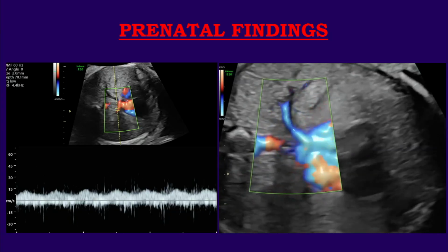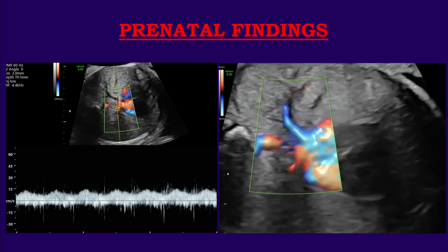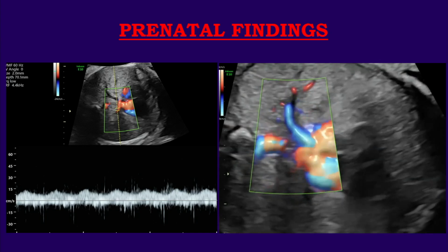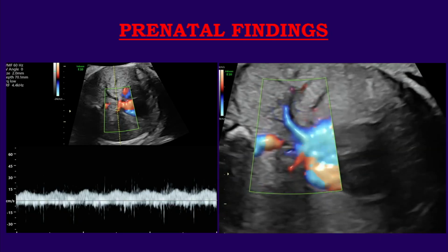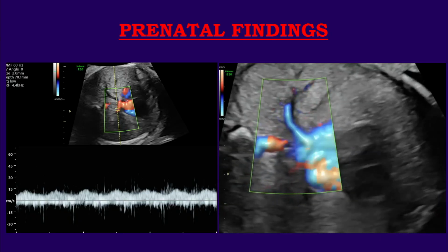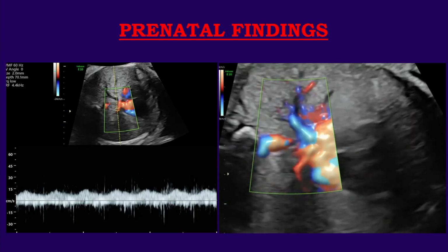So they may manifest a discrepancy at the level of the 4-chamber view. Sometimes it's more obvious, sometimes not, but this always needs to be in the differential diagnosis when you evaluate the heart in the 3rd trimester, in particular when the patient is sent for aortic coarctation evaluation.